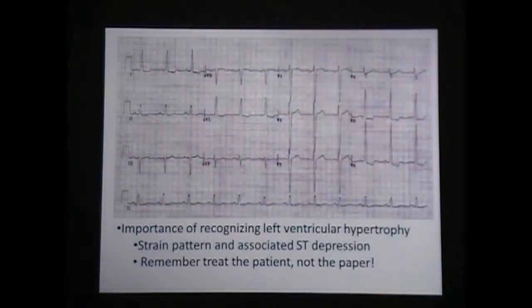But again, if your patient has active chest pain, they have this and that, treat it. But don't panic if they're just feeling fine and have general malaise. So again, make sure you're treating the patient, not the paper, but just being aware of this when you're looking at the picture and it's not making sense, just kind of cluing in your mind, like, look at what's going on here, I got S waves, okay. I'm not as concerned, but I'm not saying dismiss it. So, you have a question?